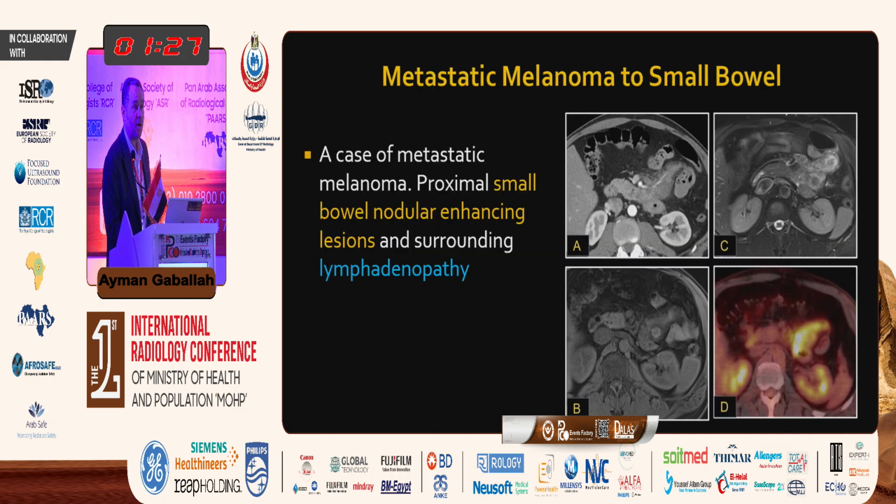And here is another case of metastatic melanoma. This is a really nice case. We had this case a few weeks ago. Thickened bowel, and one of my colleagues called it either mass or hematoma in that proximal small bowel segment.